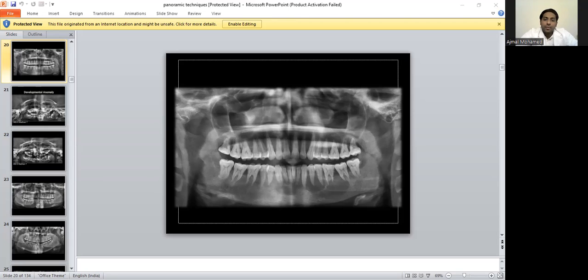Now, this is a diabetic patient who came to us with a complaint of loosening of the teeth and a severe foul smell coming from the oral cavity. He is a forest officer, most of the time in the forest rural area, and he came to us for a thorough screening. On investigation we found a generalized loss of alveolar bone that resulted in this mobility, and his diabetic level was more than 300 during the investigation. So this is diabetes-induced periodontal disease in this patient.